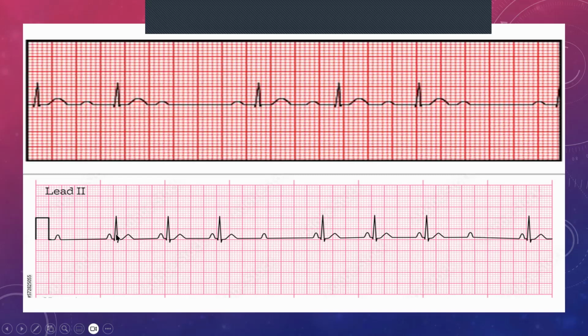And in Mobitz type 2, one of the things that I used to hear people saying, even I believed it for a while, was that your PR interval had to be elongated. Now, that's not true. It depends on where the blockage is. So in this example of Mobitz type 2, we can see that there's a normal PR interval, normal PR interval, normal PR interval, and then you get the drop beat that's happening over there. And the same thing happens here again. So that's where the drop occurs. Now, the difference with this is that it can be short and it can be elongated depending on whether the AV node is involved as well. And in Mobitz type 2, you may also get wide QRS complexes.